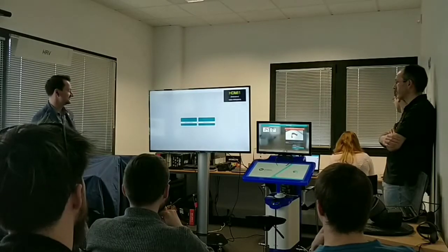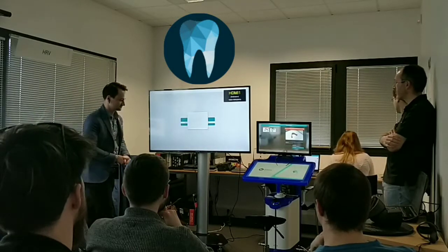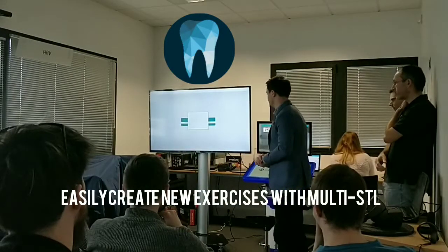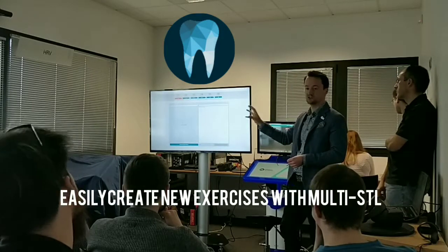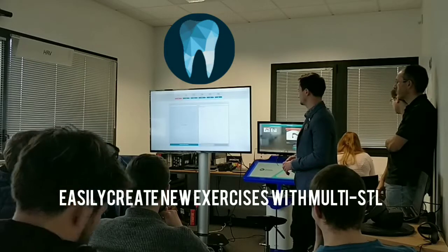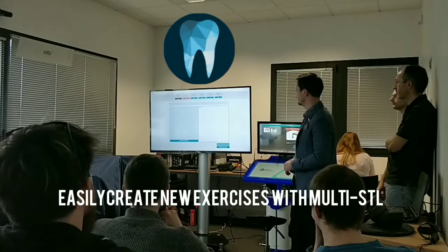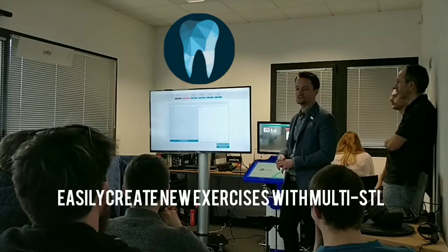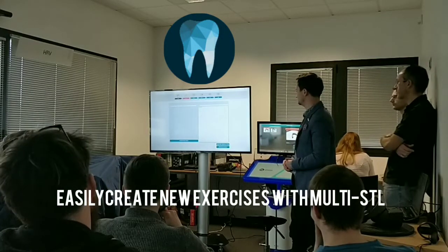And our program Virteasy Editor allows us to create a standard exercise. And from this we can create any type of exercise we like. So here is the overview. We just add in a name, some comments and an image for the navigation. We can set the level of difficulty. And same for the instructions. So this is the classroom notes for the students before they launch the exercise, and they can access it within as well.